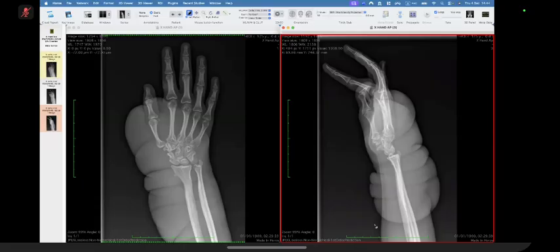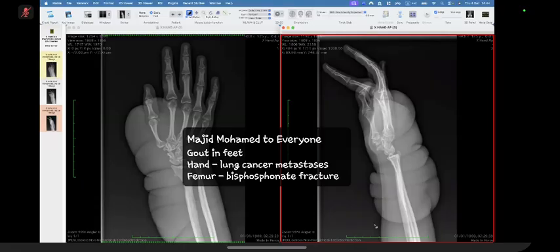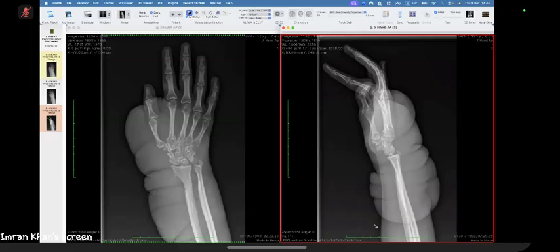If you have lymphedema from breast cancer, you would have to have it for months and years to actually cause this degree of scalloping. Is that correct? Yes. That's a lot of scalloping, isn't it? So it's unlikely to have breast cancer causing lymph obstruction causing just the selective part. Anyway, let's move on.